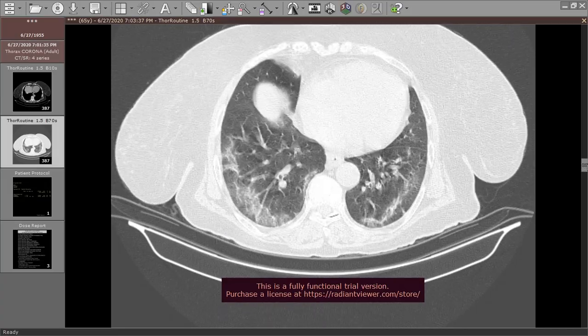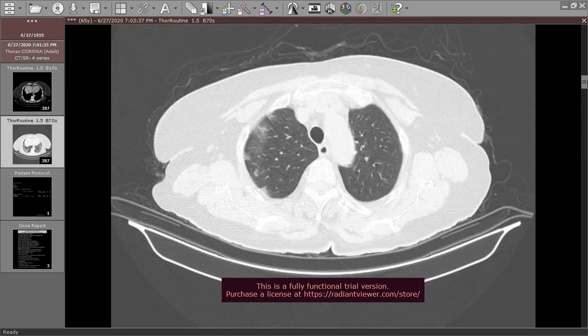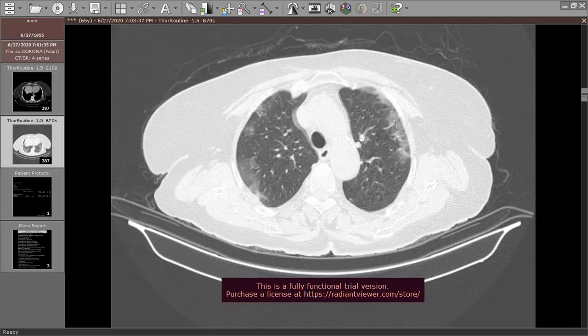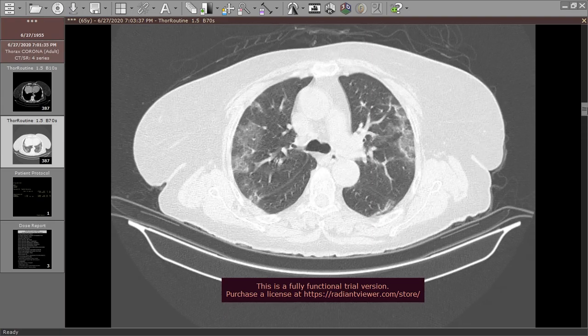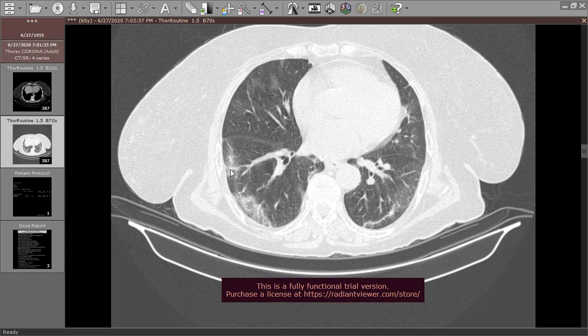Again, the main pathology here is the subpleural ground glass opacities, subpleural ground glass patches in these patients. It's also atypical viral pneumonia, COVID pneumonia. Scattered subpleural in both upper and lower lung fields, anterior to the fissure and posterior to the fissure, respectively.